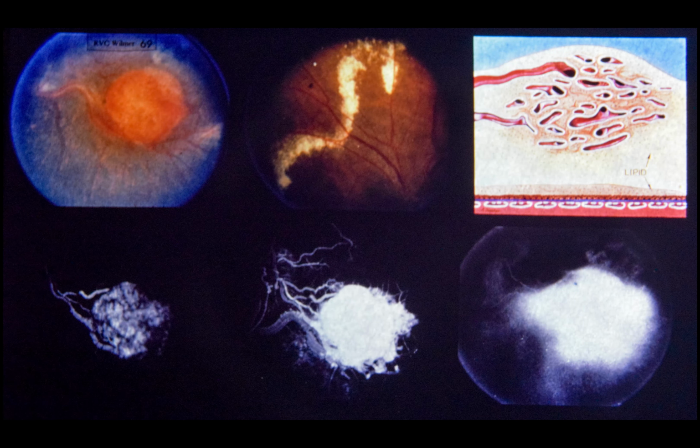Slide 69. Retinal angioma with macular detachment and cystoid macular edema. This 39-year-old black male noted poor vision in the left eye while covering the right eye. Right eye vision was 20/16 and was otherwise unremarkable. Left eye vision was 2/200. The media were clear. Upper left, note large red vascular mass at the posterior pole just beneath the fovea.